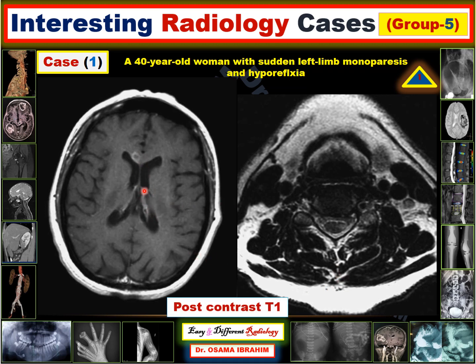If you look, there is contrast in the choroid plexus and contrast in the sinuses, as well as contrast in the superficial vessels. And there are lesions here which are showing contrast enhancement in a marginal pattern. And this one is a cervical spine with contrast also, and this part is the cord, which is also showing a lesion here which is taking contrast.